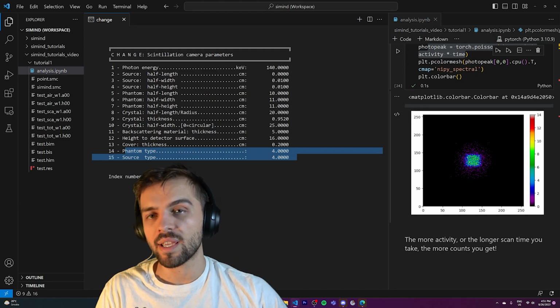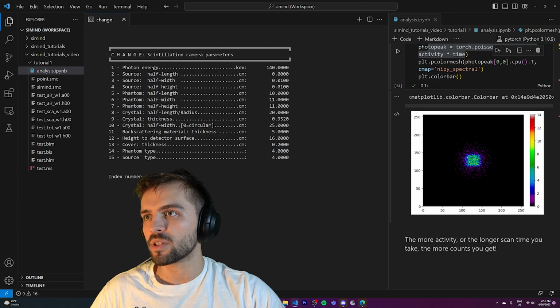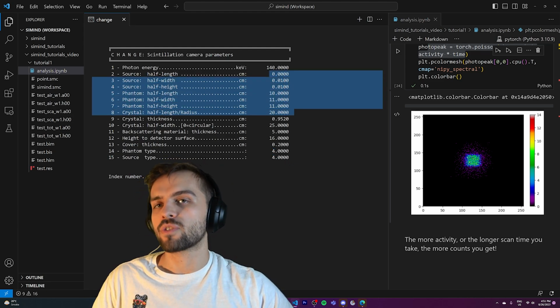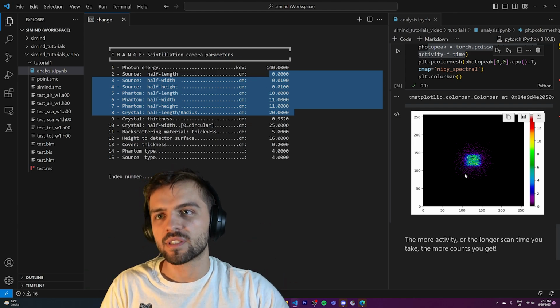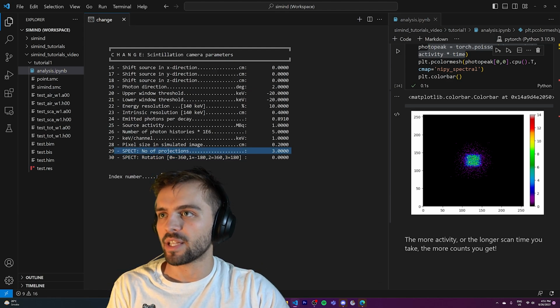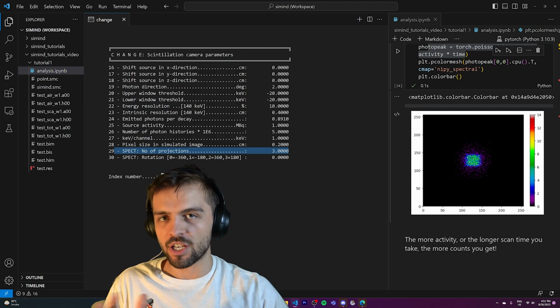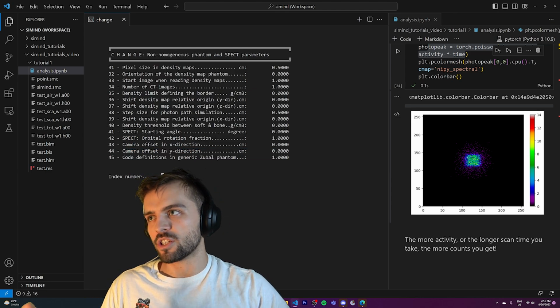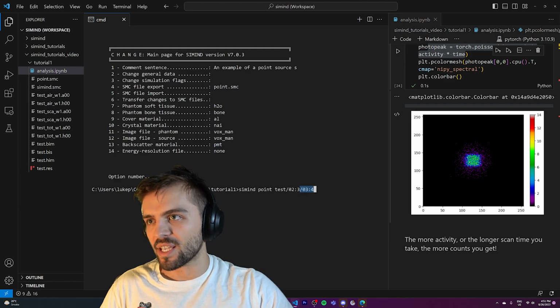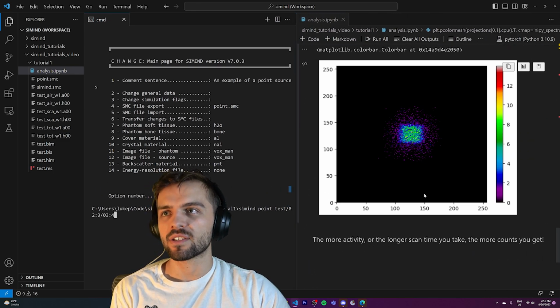Now, what I recommend doing after this video is, you have these files here. You could change the phantom type and the source type. You can change their dimensions as we did in this video. Try simulating different things, and try simulating different projections. If you want to, you can change index 29 and simulate more projections. It's really good to get a good feel for using the change program and changing parameters. You could change them in the change program, or you could do it like what I did and give the parameters here like that. So there are many options for getting used to running the SIMIND program.